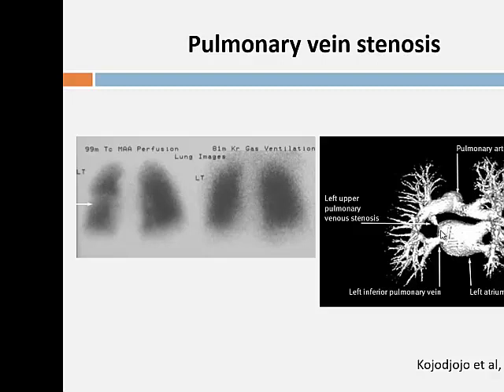And it's also helpful to identify things like PDAs, which are quite easy to miss. Because PDAs, if you think about it on the axial image, you're basically imaging through the plane of where the connection is, so it's really easy to miss. So that's why you've got to look in these different planes.